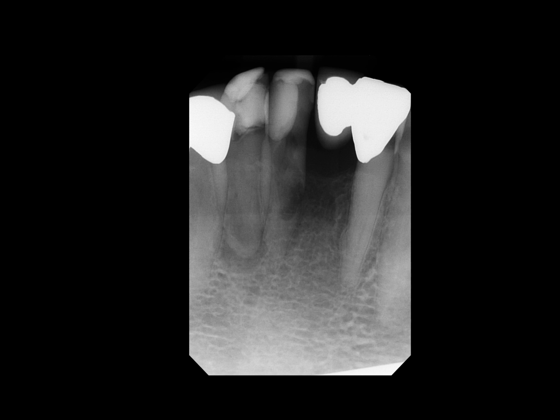This is Dr. Kim. So I have a great case to share with you today. Look at this periapical radiograph taken on the anterior mandible. Obviously a tooth is missing, so let me help you get oriented.